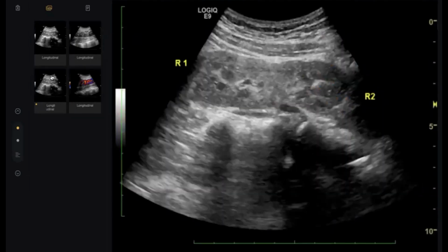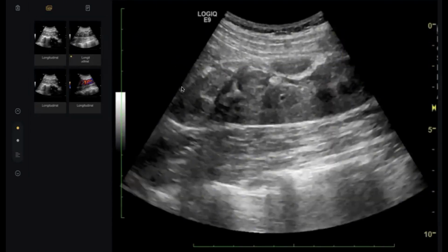So give him at least two differentials. I will examine the patient's contralateral side. If there is no kidney, I would be concerned about crossed fused ectopia. Or it may be a duplex kidney, this is the upper moiety, this is the lower moiety. I will examine the midline, though this image is not in the midline.